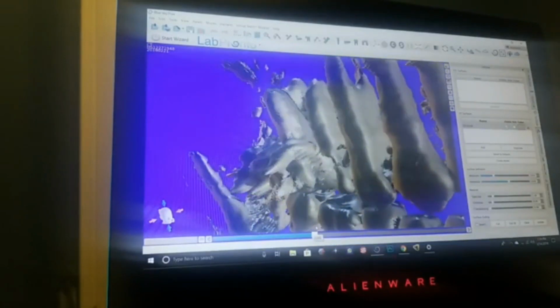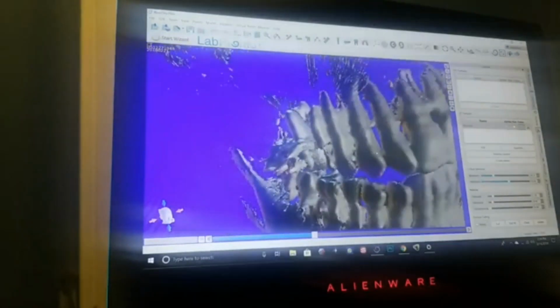Now understand, enamel and dentin are denser than bone. It's much harder to drill into them.